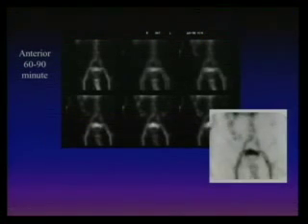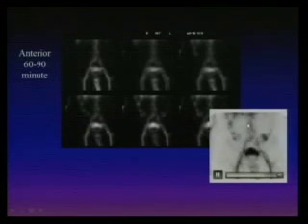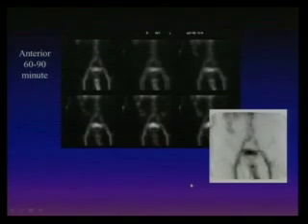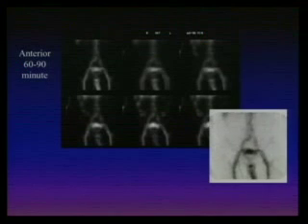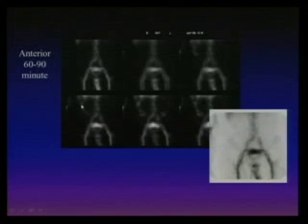So then where is the bleeding from? I tell you those are bleeding. You see they flow. Antegrade, retrograde. The large bowel, small bowel. I'm going to say it's gastric. It looks like it's going down to the duodenum and up to the ligament of Treitz. I could be completely wrong. I'm going to say small bowel right now, or it could be the transverse colon. Where? Say the location. Which one do you prefer?